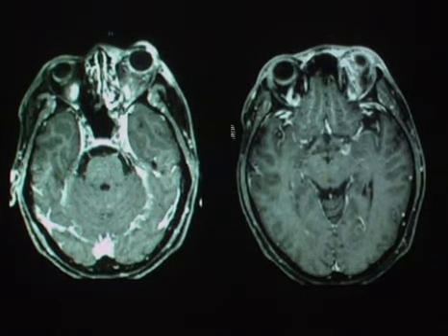What we have here on the post-contrast fat saturation imaging on the left is the presence of proptosis with increased extension anteriorly of the globe. We've got increased enhancement of orbital fat, and we've got increased thickness of the ipsilateral cavernous sinus. What we have on the image on the right is within the expected region of the superior ophthalmic vein abnormal hypointensity compatible with thrombosis. This was a case of cavernous sinus and superior ophthalmic vein thrombosis.